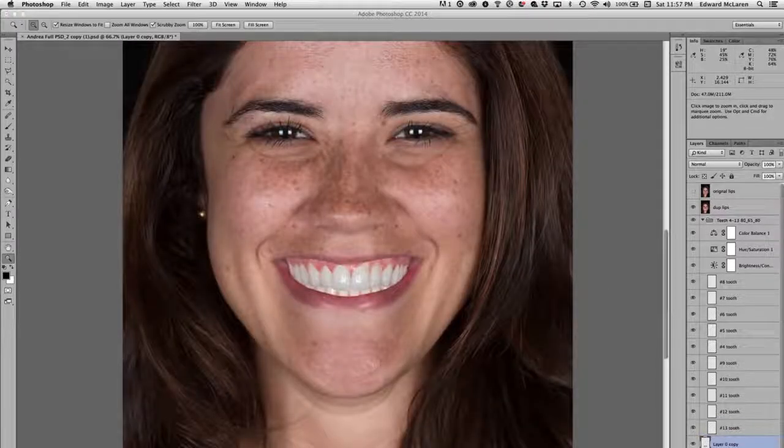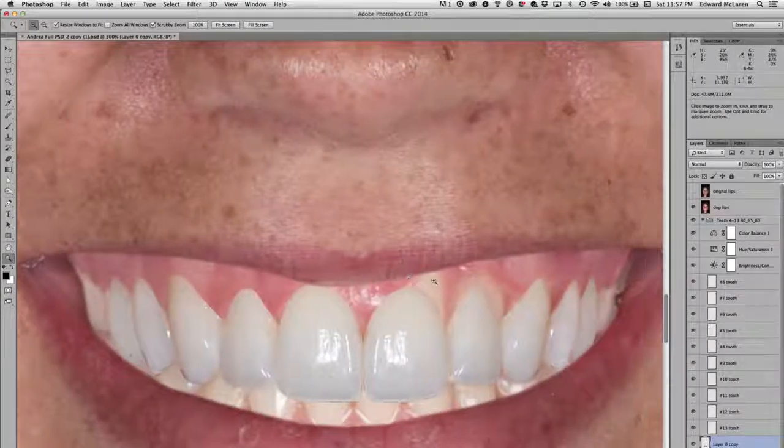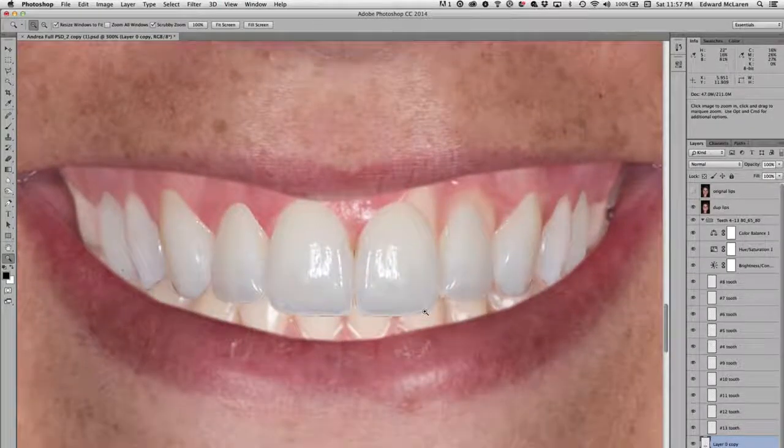Well, we've talked about how we do a smile design and bring teeth in, and talked about in this particular case where we probably do a little crown lengthening to gain a little length of the gingiva, but also at the incisal edge. But what if we had a situation where maybe we need to cover up the root or something like that? Our roots weren't exactly where we wanted to be. So what it did is it created a slightly different situation here.